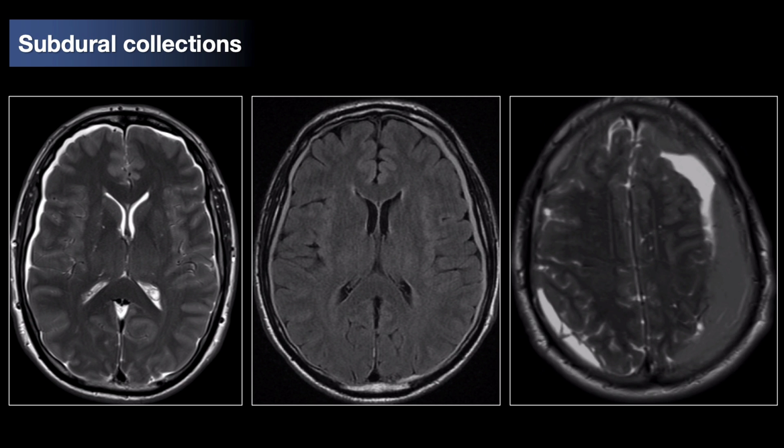And be careful, particularly in those patients with apparently spontaneous large bilateral subdural hematomas. You as the radiologist may be the only person who looks for the ancillary findings of SIH. Those patients do not need burr hole drainage. They need management of their underlying SIH.